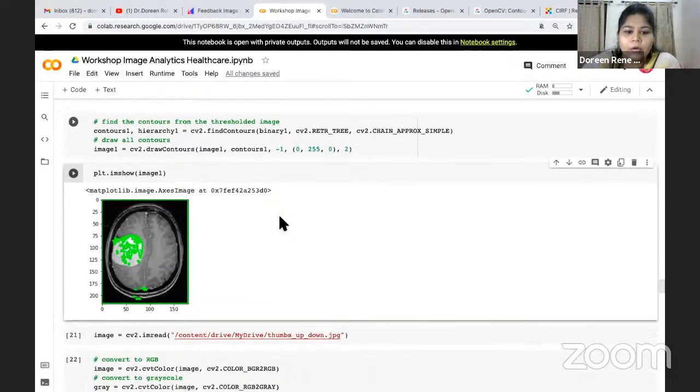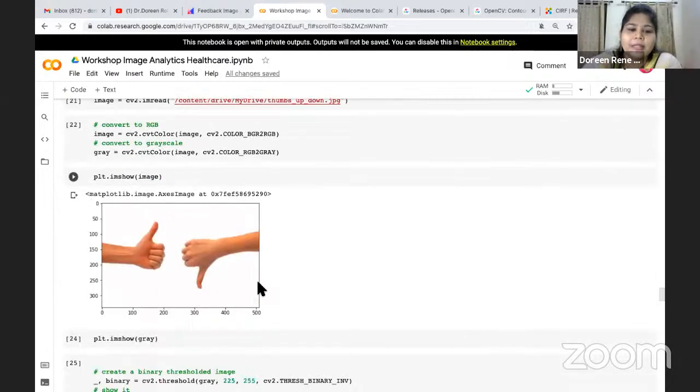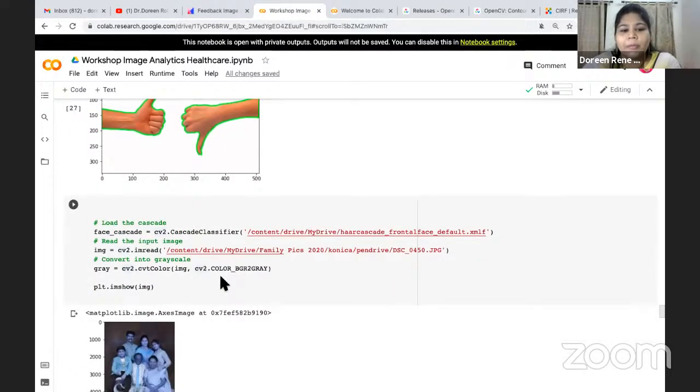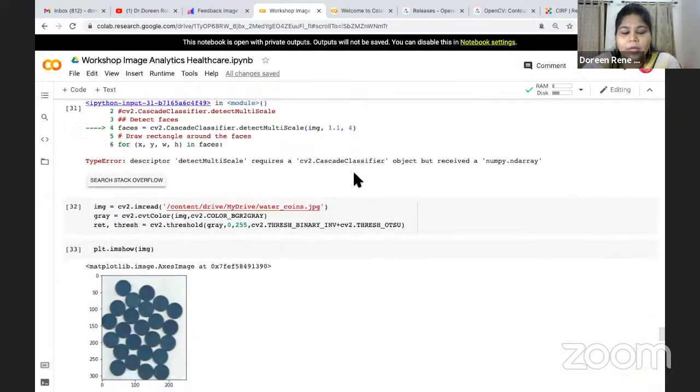We got your contours. This is another image. Here the color intensity is white, right? So you get the perfect contour. Can you see? Finding contours. But always your healthcare images will not be like this. Thank you, Nitya ma'am. Abhirami ma'am, got it? Yes, ma'am. Okay.